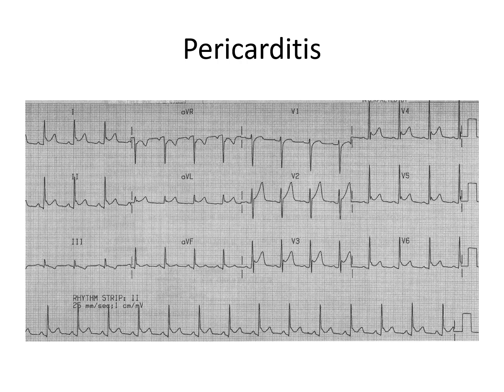So let's look at this example of pericarditis now. You will see there are ST elevations everywhere, and they don't follow the mirror image rules and the territories. So let's start with lateral leads. We'll see there is ST elevations in 1, AVL, V5, V6. So normally we should expect to see ST depressions as mirror images in the inferior leads, but if you look at the leads 2 and AVF, they actually have ST elevations as well, more so in 2 than AVF.